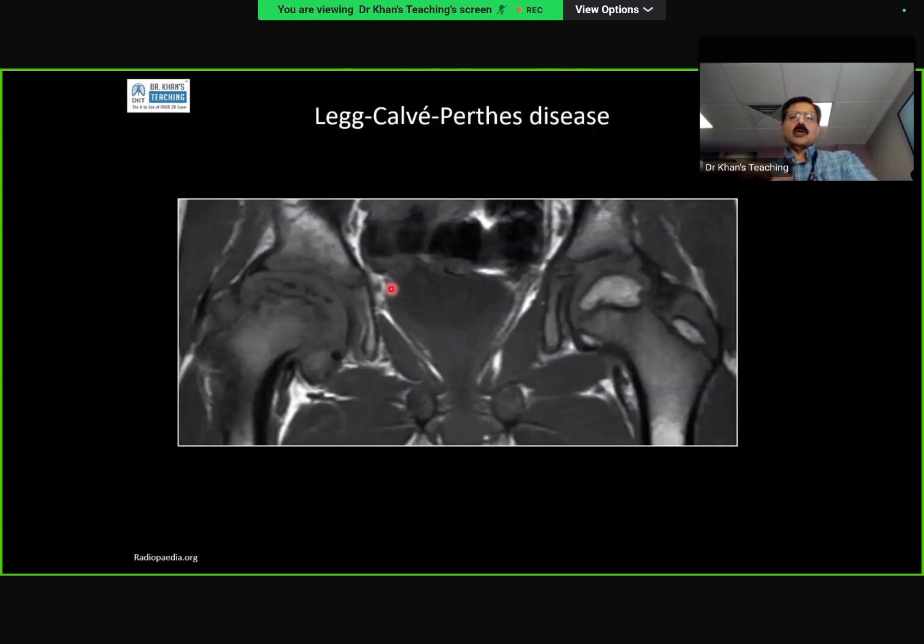This is an MR where you can see that the normal marrow is lost and there is a bit of mushrooming, expansion, etc. Thank you, candidate 4. Well done. Thank you, sir. Candidate 5, are you with us? Let me check. Candidate 5 is co-host. I have made you a co-host now.